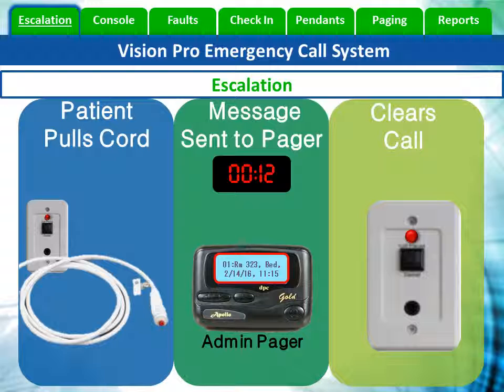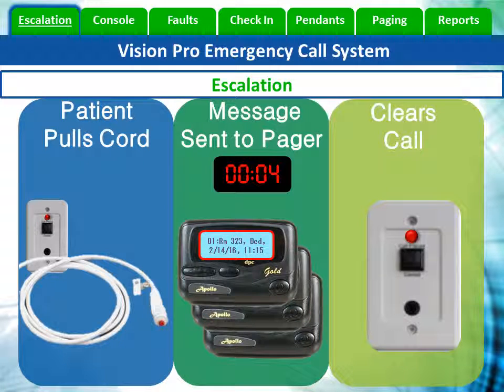So, how do we clear the call before it escalates to the administrative staff? Let's roll that timer back to the 4-minute mark so you can clear the call before the nurse on duty and the administrator are alerted.